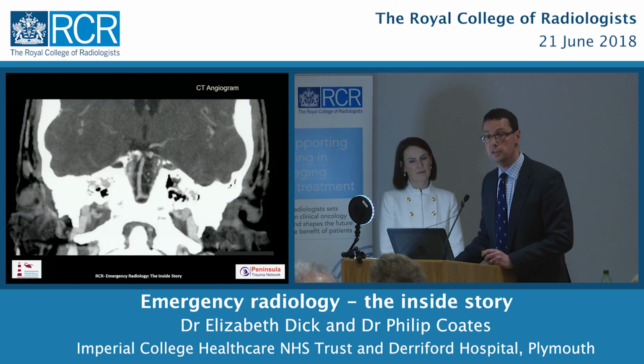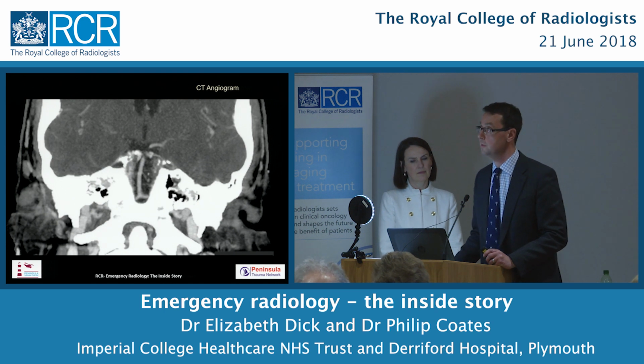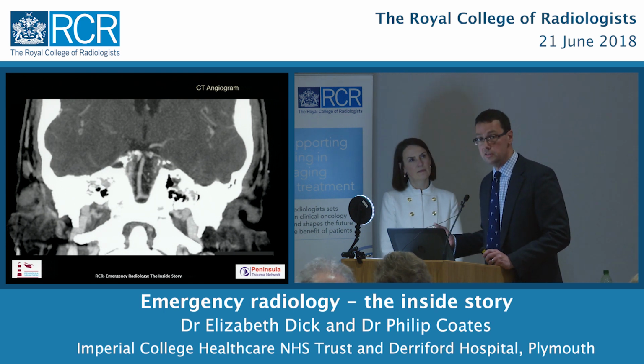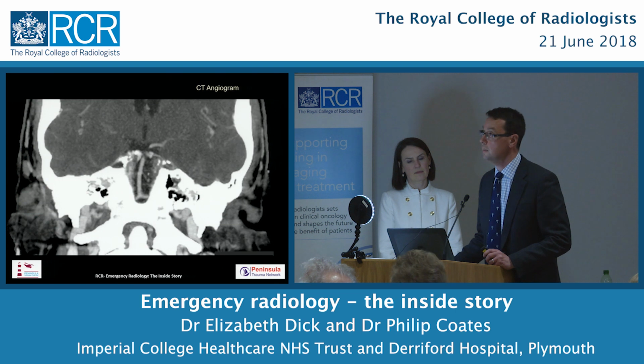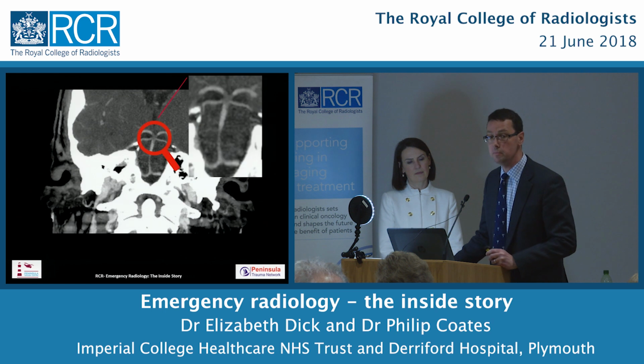So he now goes for a CT angiogram. So we repeat the CT, but he gets contrast instead through his arm. What this does is that the vessels are then outlined beautifully in exquisite detail. We can do 3D reconstruction on them. And what it reveals is this is the basilar artery here. There is a filling defect in the centre there.